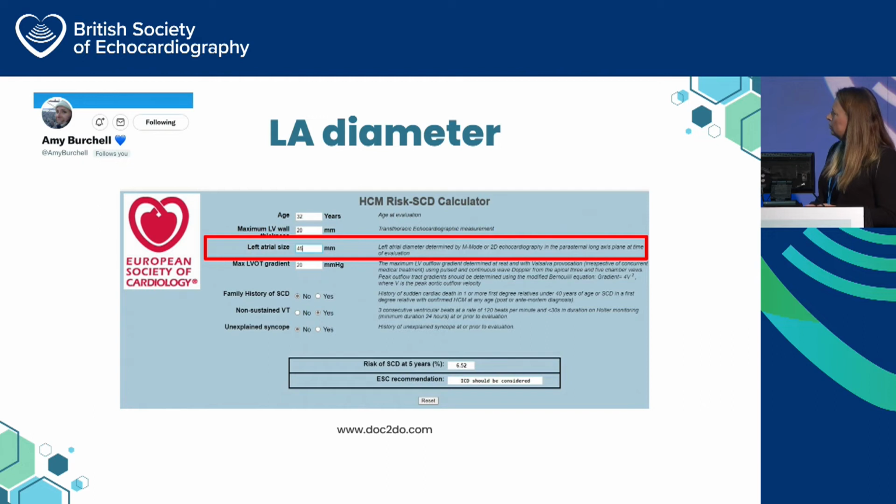Now, moving on to left atrial diameter, how we're going to measure this atrium. I'm old enough to remember a time when this was all we measured in the departments. We didn't have any other measures at the time. The image quality was really poor. And so we relied on this to give us a sense of whether the left atrium was normal size or not. The problem is it's a single linear measurement in the anterior-posterior dimension. I'll show you a picture of it in a second.